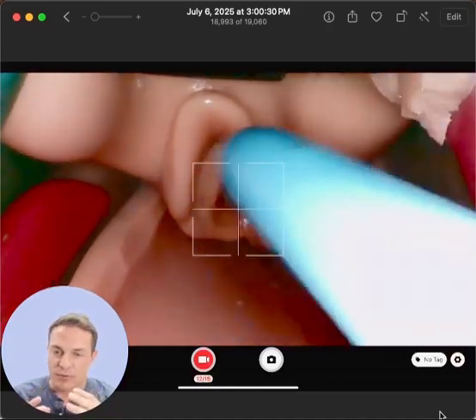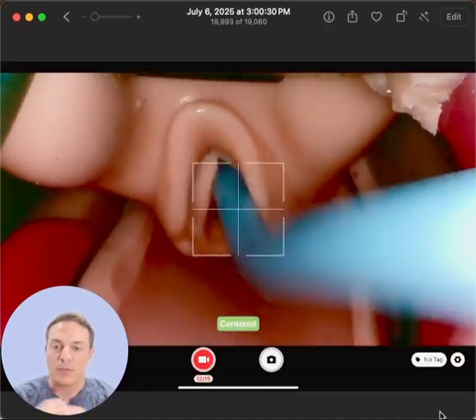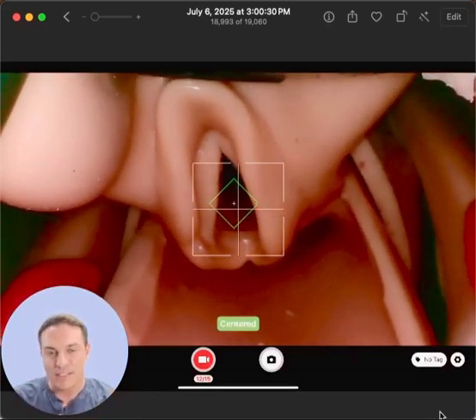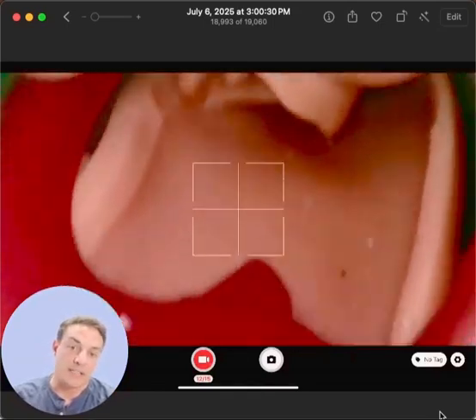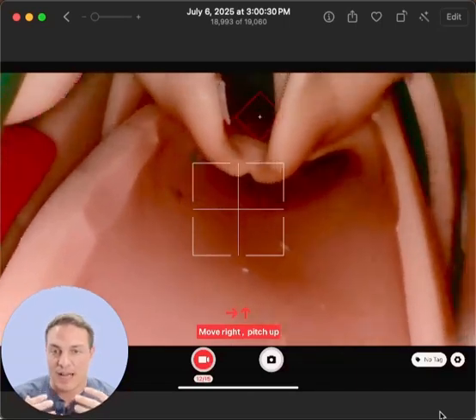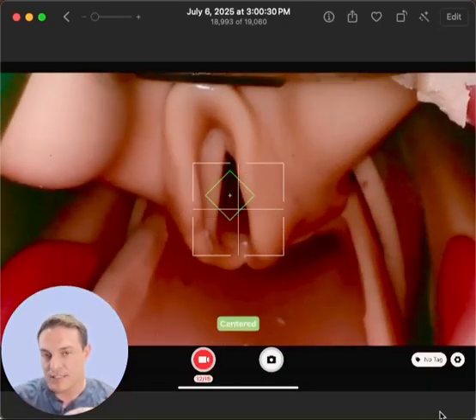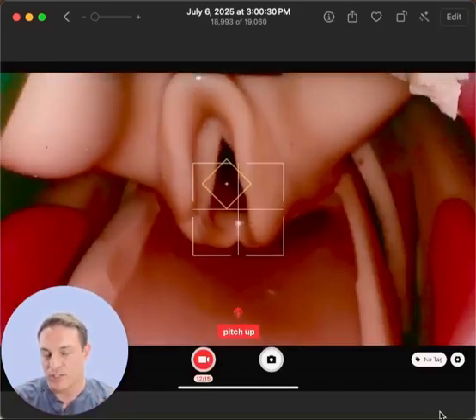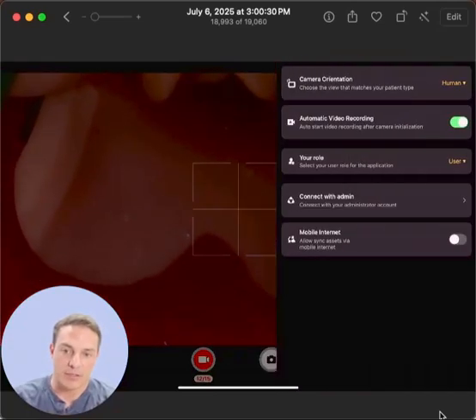I want to stress the point, this is not an edge case. We're not utilizing some very expensive equipment. We're strictly using an iPad Pro, and really harnessing that M1 chip, or M2, I think is actually on this model, because this allows us to do very advanced things without having high-tech stuff. This is not via internet. This is all local to the device itself, but we're able to do so with the model that we trained. It's interesting for video laryngoscopy, maybe not so much for folks that have had experience, but for people that are looking to learn.